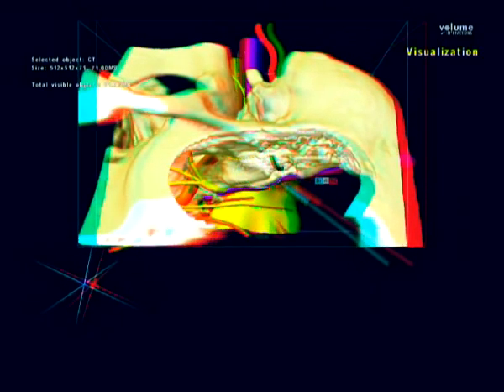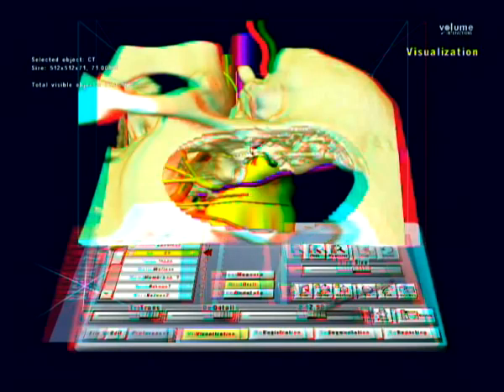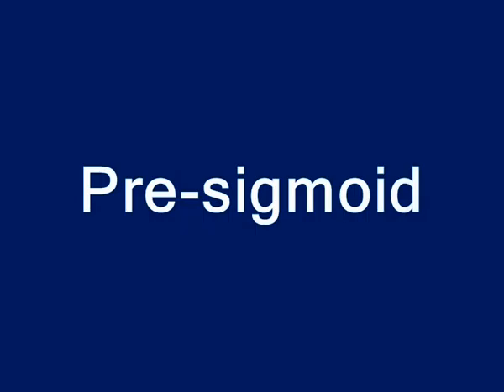them. The internal acoustic canal is located at the intersection of these two structures and is drilled to expose the facial and vestibulocochlear nerves here. Kawase's triangle, which is located more anteriorly just behind the trigeminal nerve, is now drilled extensively to show the anterior brainstem up to the level of the inferior petrosal sinus.